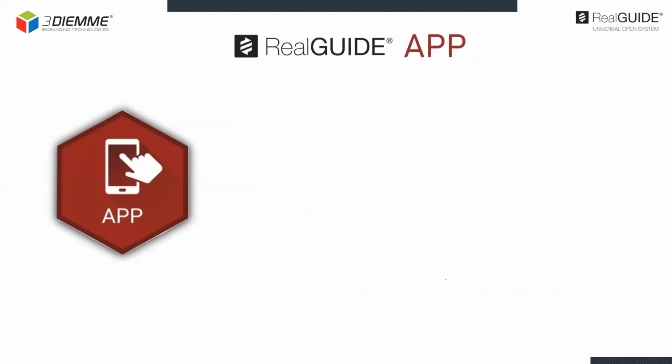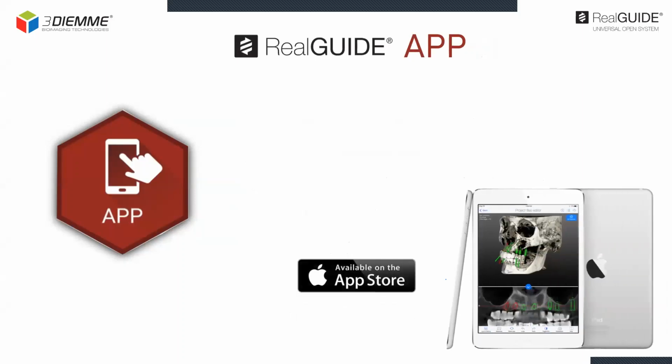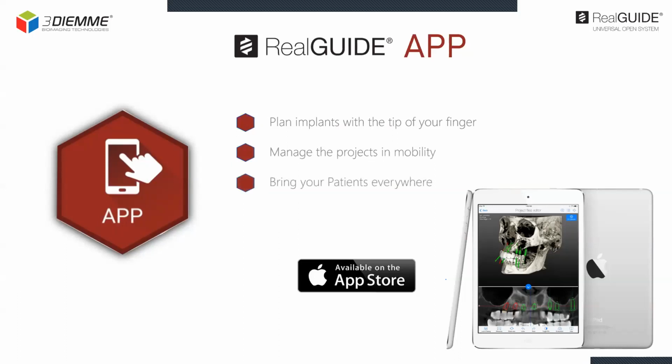As we have seen before, the RealGUIDE application is also available. You can find it on the App Store, and it allows you to plan and share your cases anywhere with your iOS devices. You can plan implants with the tip of your finger, manage the projects in mobility, and bring your patient everywhere.